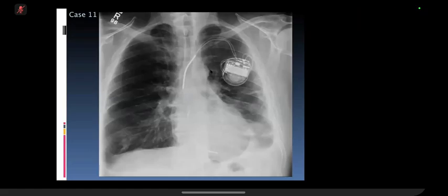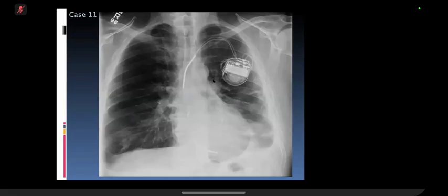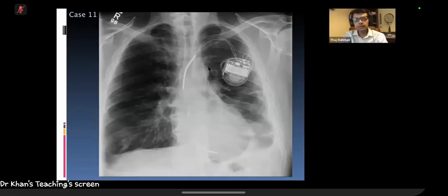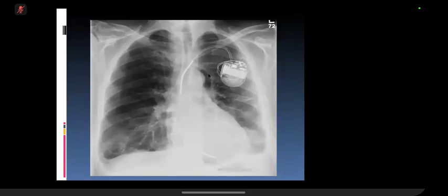Okay, being pointed to the left side of the aortic knuckle, I think there's increased lucency, which would be in keeping with an injury to the mediastinum, therefore pneumomediastinum is present. Yeah, so there is pneumomediastinum here, again lucent area along the aortic knuckle. In the next X-ray, it's much more obvious.